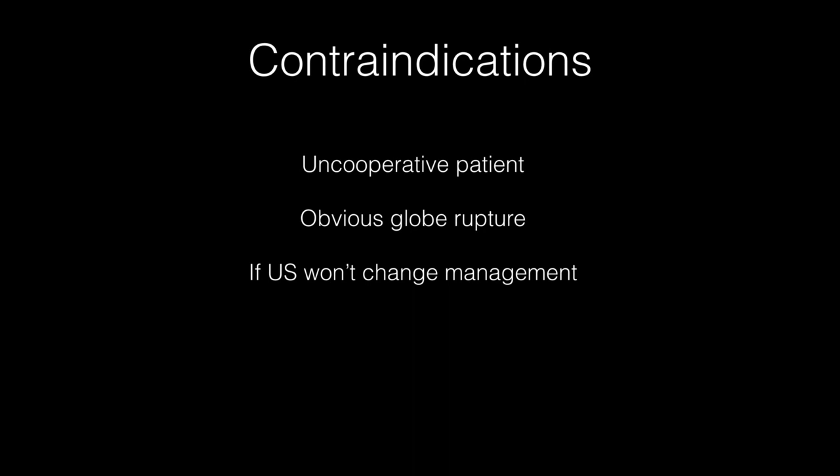With an obvious globe rupture, ultrasound really won't add much to your plan. If they clearly have a globe rupture or an object sticking out of their eyeball, you leave that for the ophthalmologist. And if the ultrasound won't change management. But still, your ultrasound doesn't replace an ophthalmologist, but it can still help you with your exam.